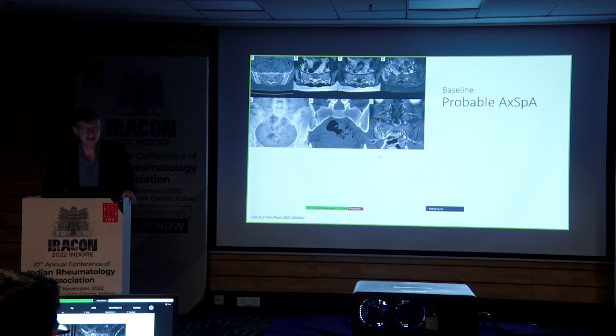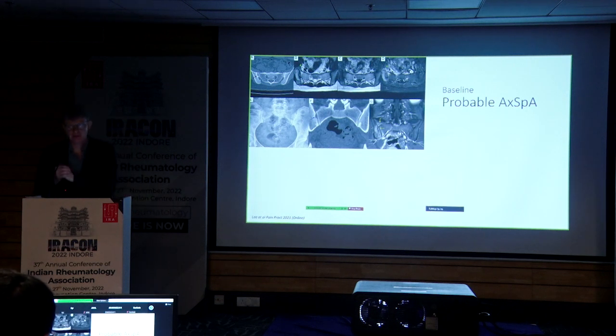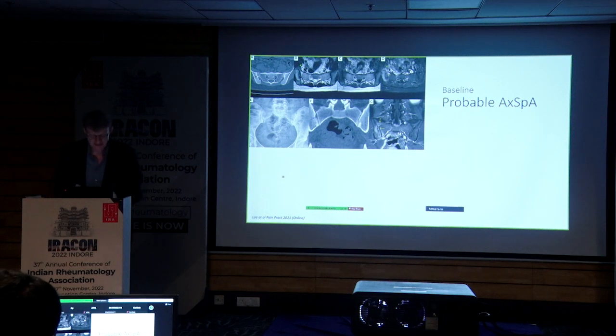The challenge is if it's more subtle infections. This is a case, which I know is very small. If you have a chance to look at it, then look at your screen. I know it's small.